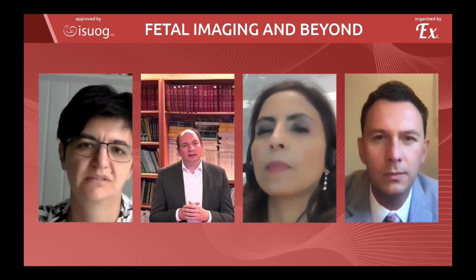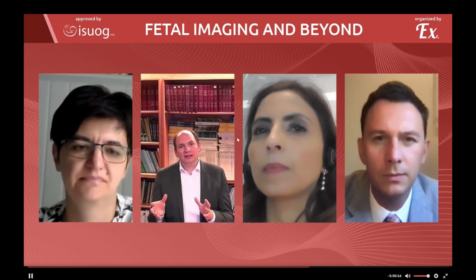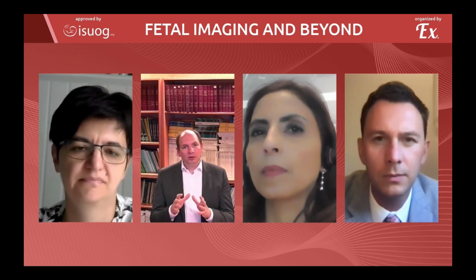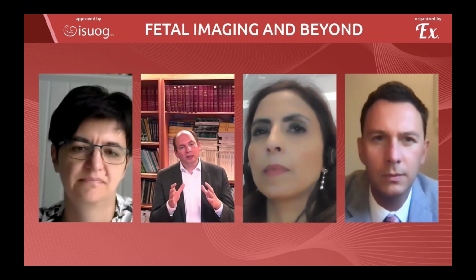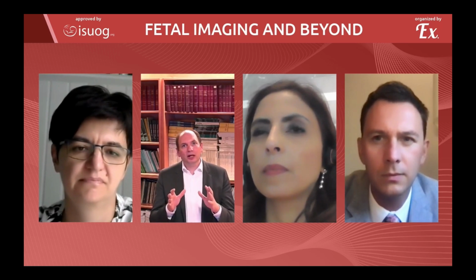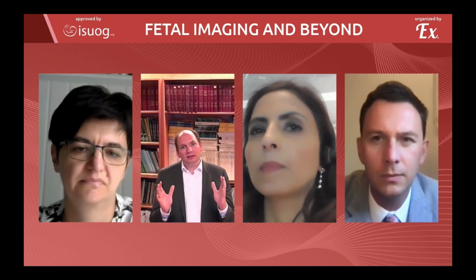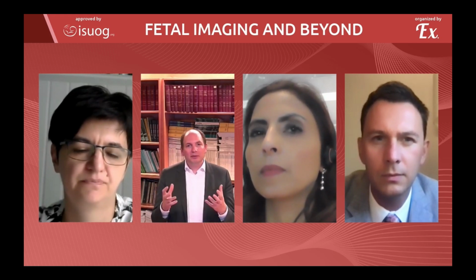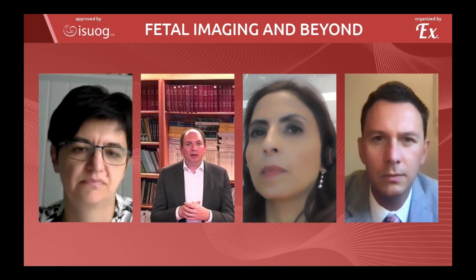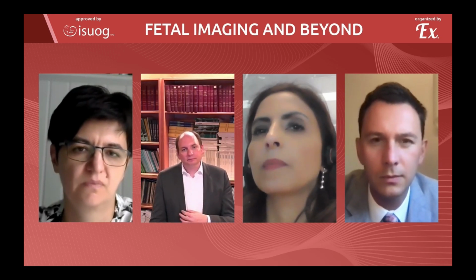So the paradigm earlier is not so good and less sensitive. I think we cannot uphold this. Early MRI is good. Then we have basically the period where MRI is really very good. I would think that's between 24 and 34 weeks. This is the best time period, because the babies do not move a lot during that time period. We have time and we can see the brain very nicely.